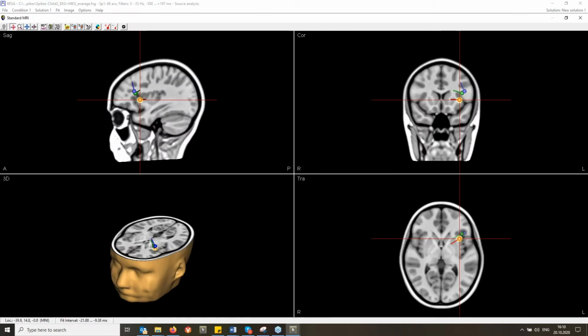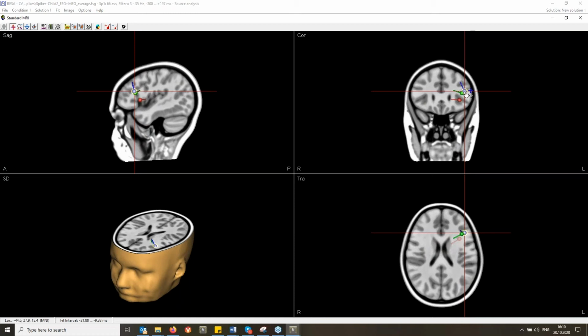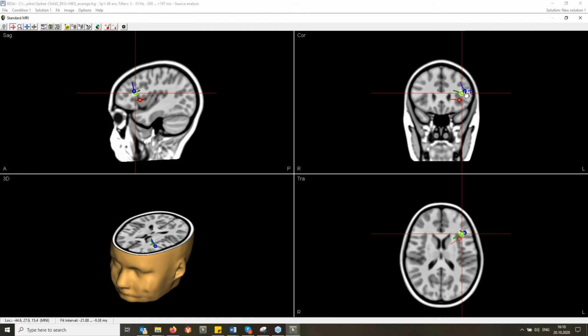I can see the difference in localization. My EEG source localized a bit deeper. The MEG and combined source localized in almost the same location. However, it is noticeable that the orientation of the combined source resembles that of the EEG source. For MEG only, we lose the radial orientation component, so the orientation gained with EEG is more reliable.